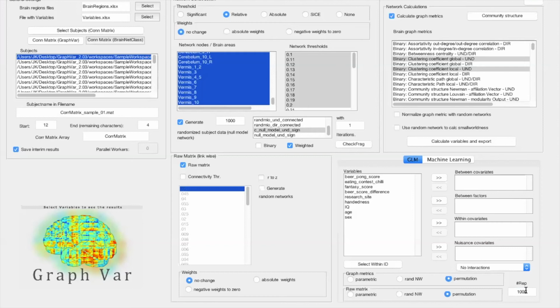And then for the real group, which has no ID shuffling, the same test statistic is drawn and, as I just said, is put into the respective null model distribution that you generated. This is usually faster than if you would use the random networks that you generate here, but this depends on your kind of hypothesis.